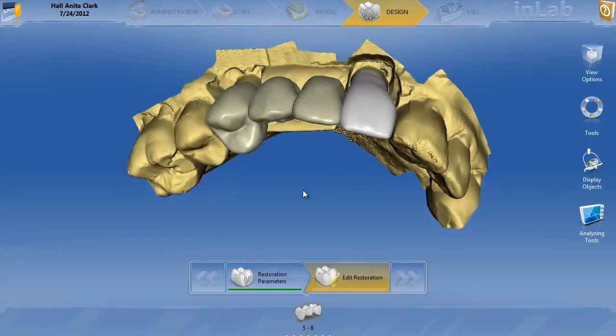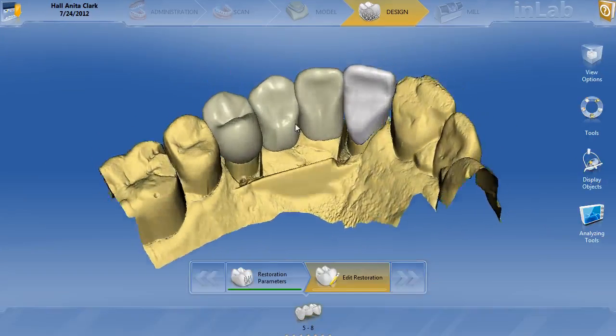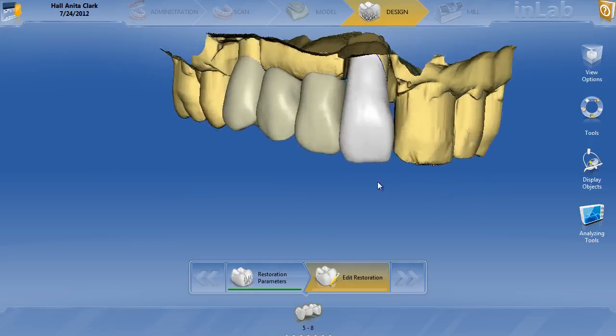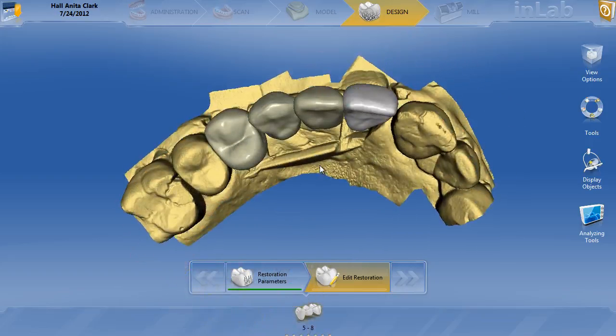And here's my initial proposal. So I would say this is actually a pretty fantastic proposal considering the scenario. Everything's lined up correctly. And this will be very easy to fix, to be honest with you. So we got a little work to do on the central. That was probably proposed badly just because of this other bad central, but really lined up good, and it looks great.